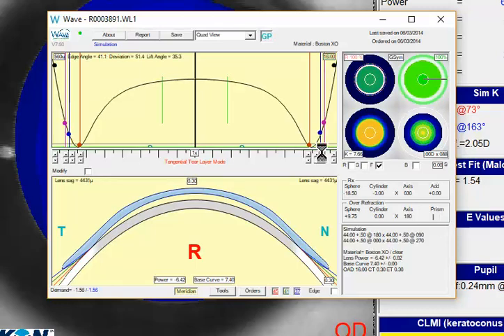And just a couple more clicks. And now we're at about 40 now. We got our lens sag back down. 4371 is now 4422, so kind of close. You can adjust this a little bit more if you want.